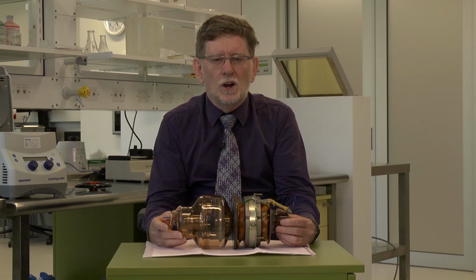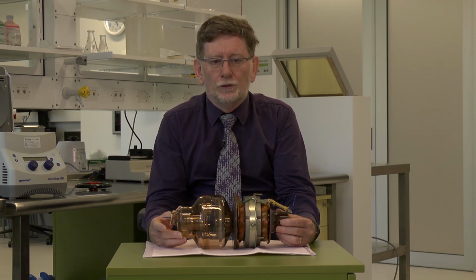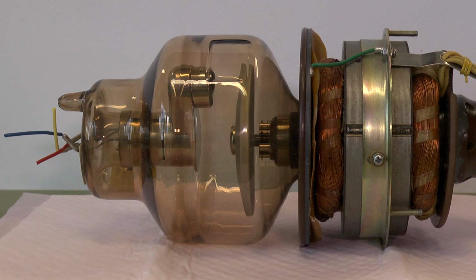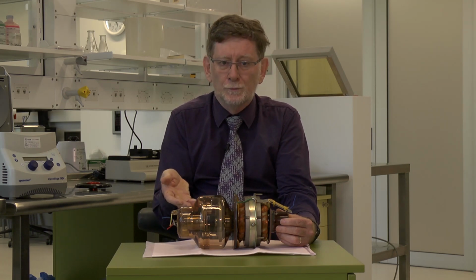So producing heat inside a vacuum is a problem, but it is hard to get rid of it. A large anode can be used to absorb the heat, but this relies on conduction. If the conduction is not rapid enough, the anode will start to melt. So to increase the capacity, the anode is rotated. A new surface is continually exposed to the electron beam. By the time the anode rotates through 360 degrees, that spot of the anode has had a chance to cool down. So let us start by having a look at a real X-ray tube.